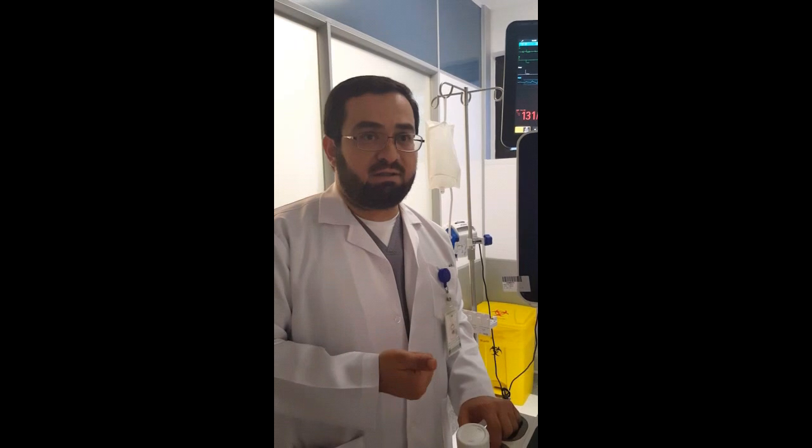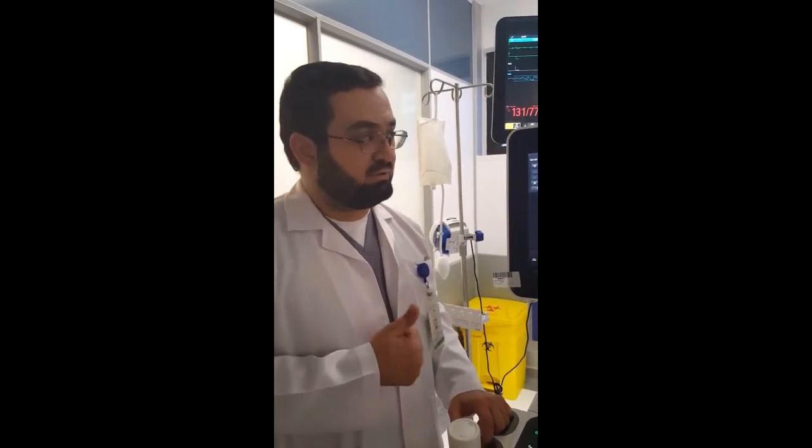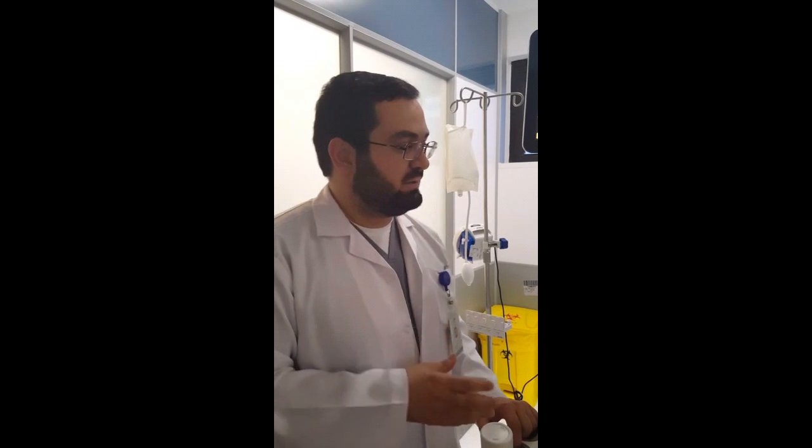The IVC is very important. If you have a dilated IVC, that means you are dealing with severe pulmonary hypertension, especially dilated more than 2 centimeters in diameter and not collapsing. Collapsing means that on inspiration it collapses more than 50%. This indicates you have a very high right atrial pressure and is a surrogate for severe pulmonary hypertension. And it's very important for follow-up.